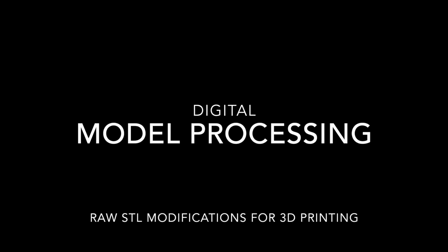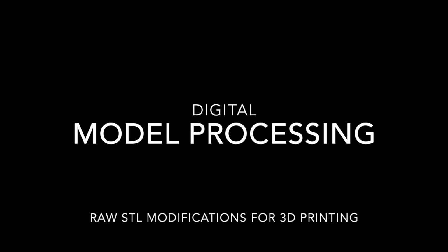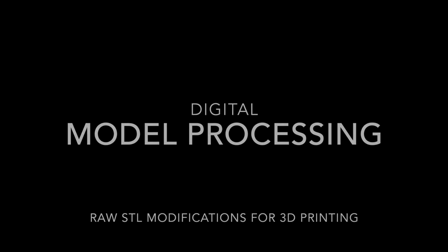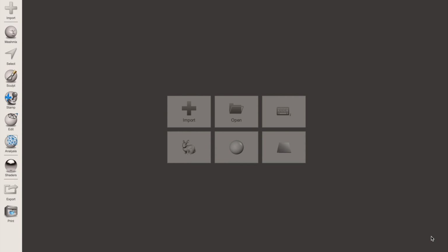Hi, this is Dave Jensen, and today we'll be looking at digital model processing for raw STL files in a few different applications for 3D printing. So we'll be using Meshmixer for the application to process our models.